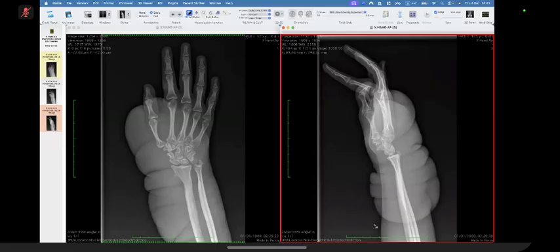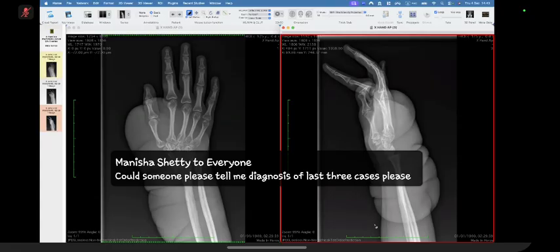Okay, and the second question, and this is me trying not to discount what you're saying, but trying to teach you some things, right? Yes, sure. Do you think it's reasonable to say that there is scalloping of the bones in this patient? Yes, there is scalloping of the bone, and I think it may also cause scalloping in the bone, but more on the distal parts of the hand there will be scleroderma, and also the skin will be tight, not edematous.